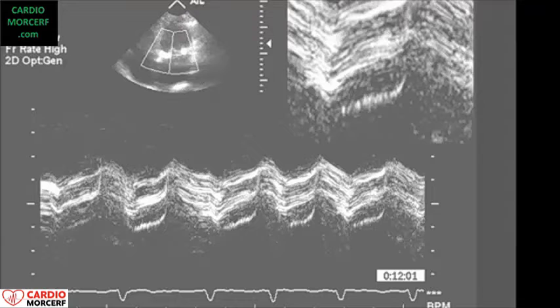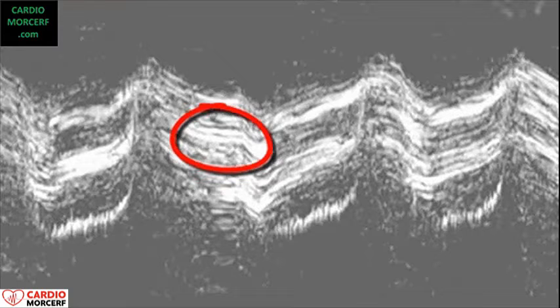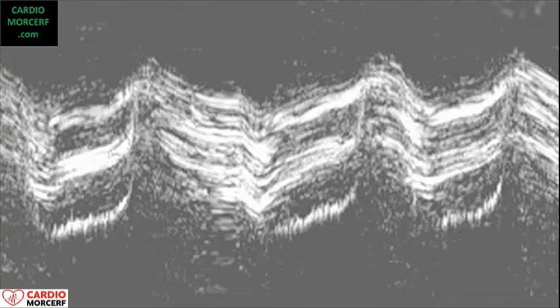Another example: apical 4 chambers view of a biological prosthetic mitral valve in a patient with endocarditis suspicion. 2D echo non-diagnostic of vegetations. M mode shows some thickening due to calcification. See how these echoes are formed by lines with smooth borders, classical of calcium or plain thickening. But not here. This is the torn paper sign of a vegetation. Notice that it is not a large vibration as seen when the leaflet is just ruptured.